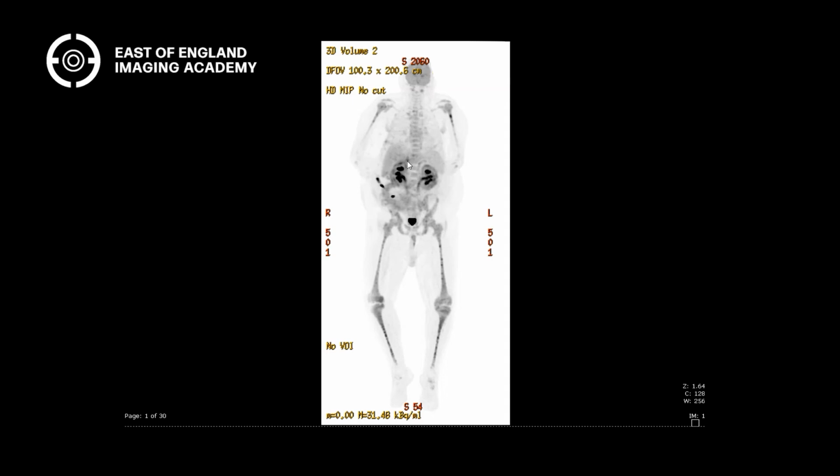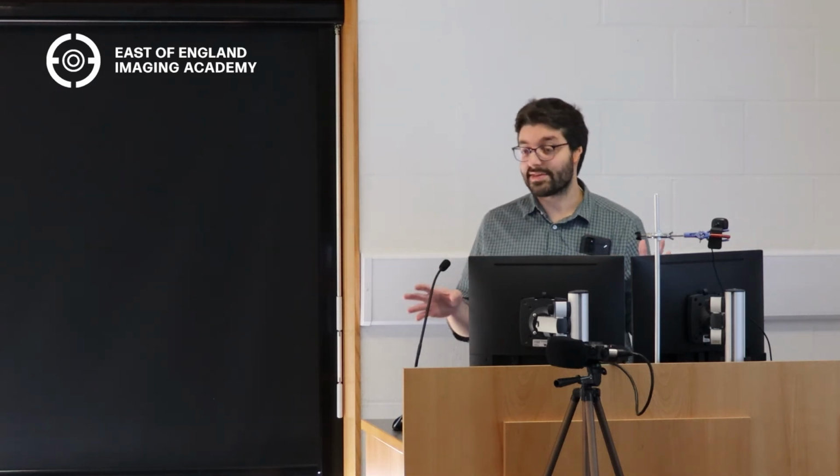Lots of uptake in nodes. A lot of what you're seeing here is in nodes. The stuff in the abdomen you're not seeing quite as well. You can see the kidneys are hydronephrotic because of all the soft tissue around them. This patient had Erdheim-Chester disease, which you may never have heard of. But in the past 10 years, I've seen at least 5 or 6 cases of it, and cases of cardiac hydatid disease, and really bizarre things you just find in footnotes in textbooks. It's so much fun. I honestly can't tell you how much fun it is.